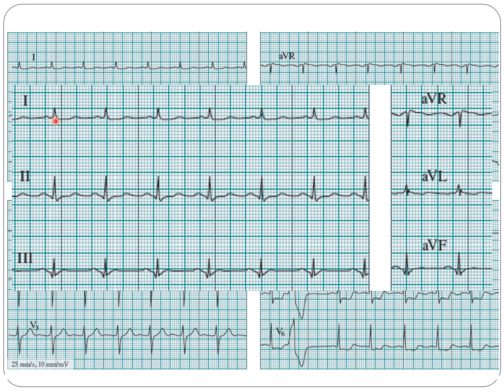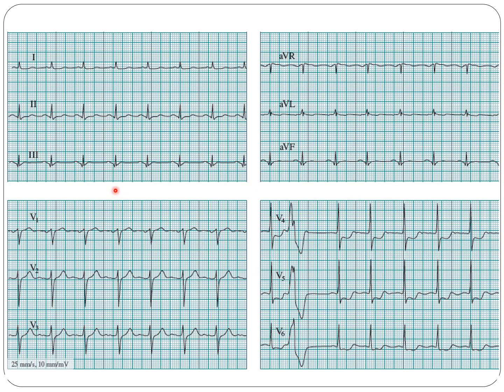Next, the QRS, the width of the QRS. It should not exceed 0.12 seconds, so that's fine. This means narrow QRS. Now, first, we have to look at lead number 1 and AVF because they are both positive. For sure, the axis is normal. If you find a normal axis, the next one you should look at is 1, 2, and 3. Which is the biggest one? Lead number 2. And 1 and 3 are about the same, so that means the axis is around 60 degrees. If you check the AVL, it is about equiphasic, meaning exactly perpendicular to AVL is lead number 2. So the axis is 60 degrees.